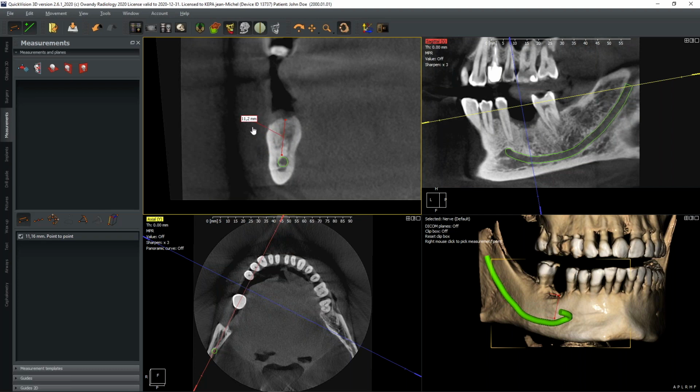And you see now the measurement. The measurement is collected here. It's like a library. I move the stamp if I don't want to sit in the middle. And I also measure that side here, the thickness of the bone. This is an area where we like to set an implant. Well, measurement is easy like this, and we may measure on each view.